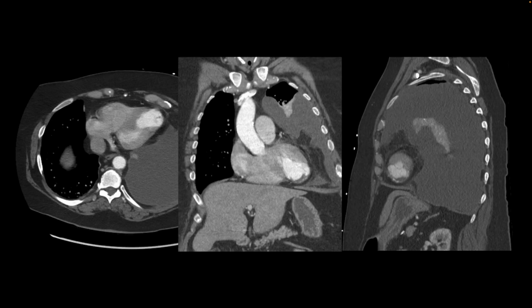This is our next patient. The finding was incidentally seen. It's not the large left-sided pleural effusion that is also seen here, but the finding is in the apex of the left ventricle. You see how the myocardium here is very thin, and on top of that, there is this hypodensity that is attached to it, seen here on the coronal and also on the sagittal.